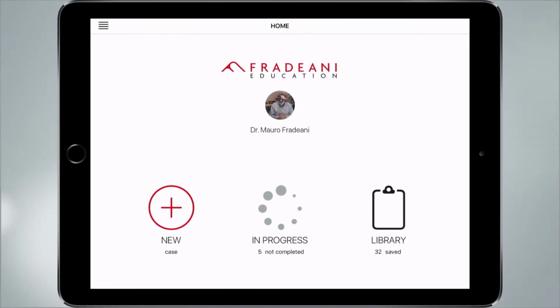We are in front of the patient and we have to decide what to do. It means that we have to do a new case in this particular situation, and so we push the red button over here, new case. Of course, together we have the library and in progress cases, so cases that were already examined but not finalized yet. So now we are approaching a new case and we push new.